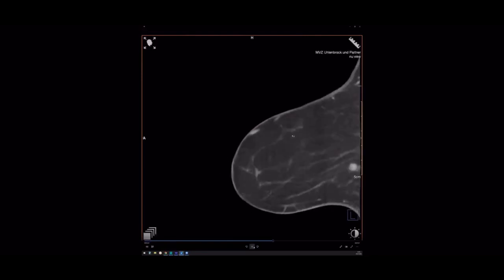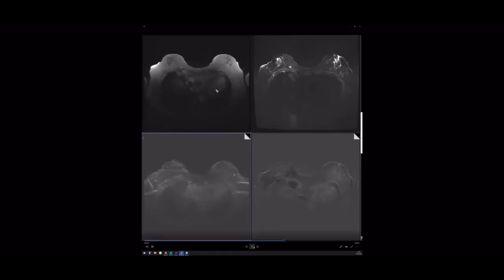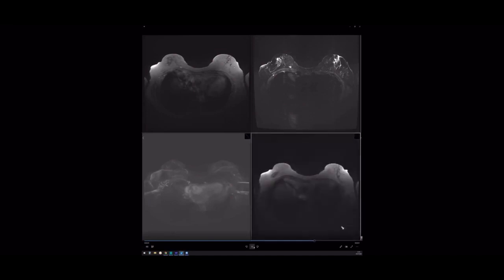But to show you the competition between the CT and the MRI, I took the older images, an MRI which I got just last week, and you see the intake of the contrast, but in MRI you can figure it out maybe as a sharply delineated lesion. You see the contrast enhancement, and also the ultrasound wasn't quite clear. It was a hypoechoic lesion with some sharp delineation and no shadowing at the back.